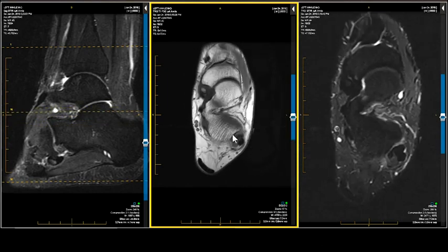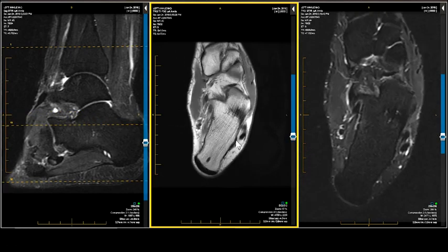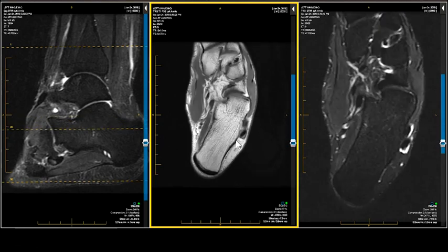And wow, we have another accessory peroneal calcaneal, this time not tendon, muscle, inserting on the peroneal calcaneal tubercle. So far you've seen 3 accessory abnormalities in the peroneus distribution and 1 accessory abductor hallucis.